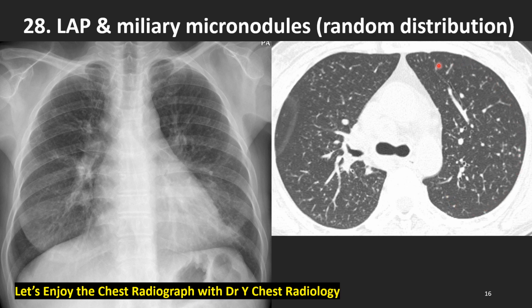This is miliary tuberculosis. No single area of normal lung. Yes. Lymphadenopathy with miliary micronodules. This is active tuberculosis findings.